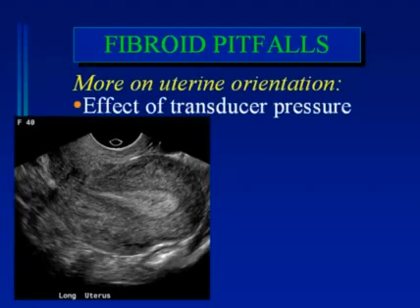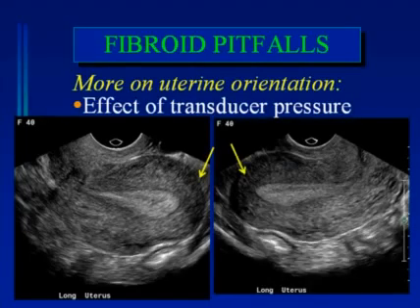And it's not just degrees of bladder distension that can do this. On an endovaginal ultrasound, the uterus can look both retroflexed as it does here and anteflexed as it does here during the course of a single examination, and this is thought to be due to transducer pressure. In this particular patient, the uterus was flopping into both positions multiple different times depending on how the transducer was oriented and presumably on how the pressure was affecting its orientation. But this is relatively uncommon. In most cases, the uterus will stay one way, either retropositioned or antepositioned throughout the study.